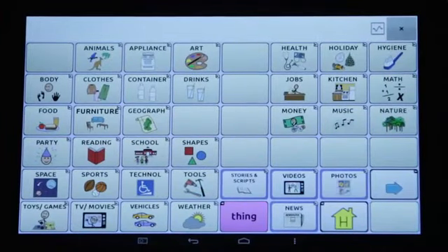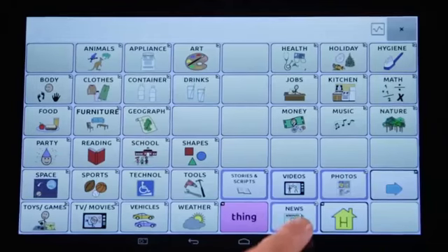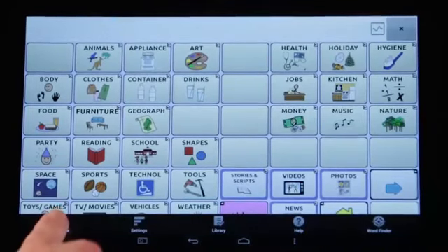For this demonstration, I am going to create a custom scan for the Groups page. The Groups page has already been edited and rearranged to allow alphabetically ordered blocks and an Other block. To create a custom scan, I need to access the Scan Editor through that page. Tap Menu and Edit Mode.